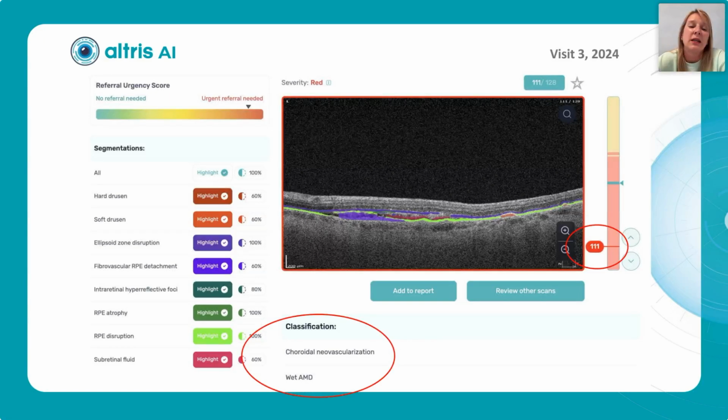It could have been easily missed by eye care specialists because the situation changed in the lowest part of the macular area. But AI helped us, first of all, to detect changes. Second of all, we could calculate all those changes, understand that the situation has changed, and that we need to change treatment in this patient. Such situations are not typical.